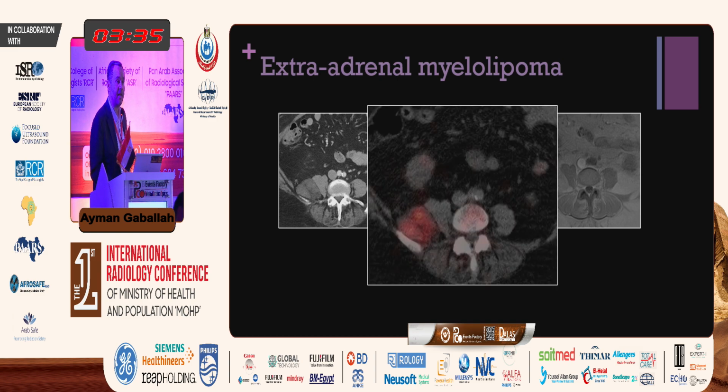And hopefully you are familiar with that image. Are you? Do you know what it is? I found that so many radiologists, actually my colleagues, none of them were familiar with that imaging technique. It's a sulfur colloid scan. And this mass was taking up sulfur colloid. This means the mass has a myeloid component, because liposarcoma will not take that up, but a myeloid component will, in cases of myelolipoma or sometimes extramedullary hematopoiesis. Both of them will take that up. And this means this is a benign lesion, and leave it by itself.